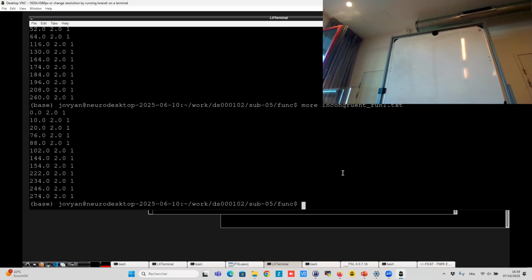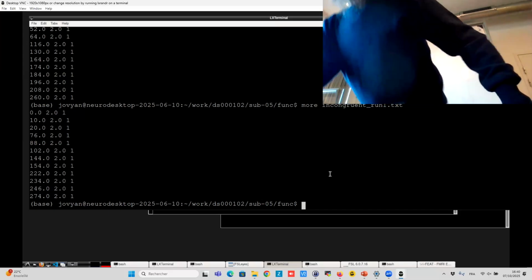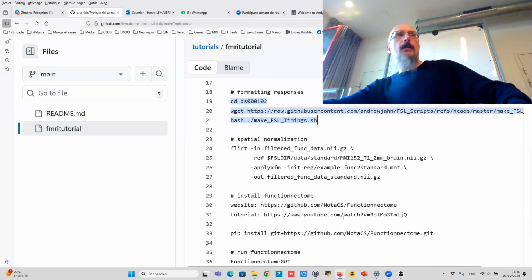So which one of the text files responds to what? A stimuli. Here it's the timing, the onset. And the second is the duration. Okay, so the first stimulus is incongruent, and it's 2 seconds. And you have that for all the stimuli. Yeah. Thank you. You good? Yes.